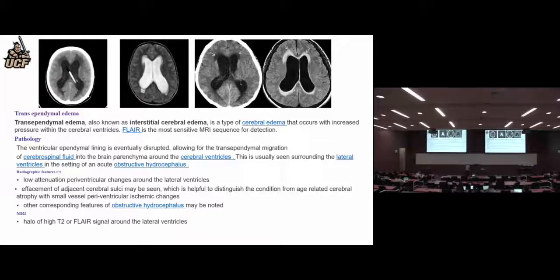This may be a contrasted T1 image, and you see it on here. But see the FLAIR, this is another place where FLAIR really shines, and the pathology really shines, literally. You see the FLAIR has made the ventricular fluid dark, but amazingly, that fluid, when it comes out into the tissue, and I guess because it causes some kind of tissue reaction, is bright. So this is really good for seeing the transependymal edema.